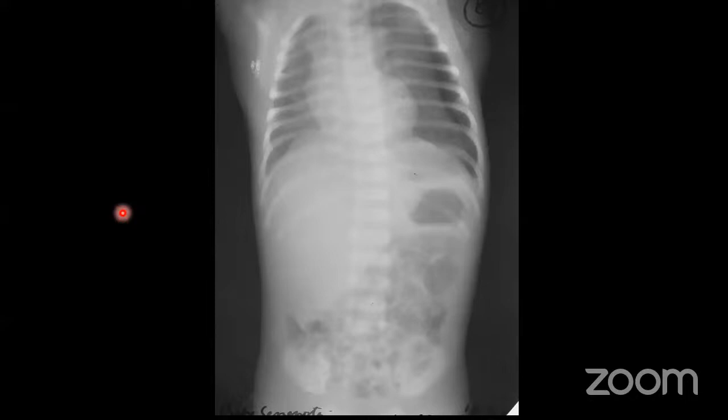Now we are coming more closely to the costophrenic sulcus. Answer very fast. What abnormality were you seeing here? Any answer? Be very fast, otherwise I will not be able to finish. No answer till now.